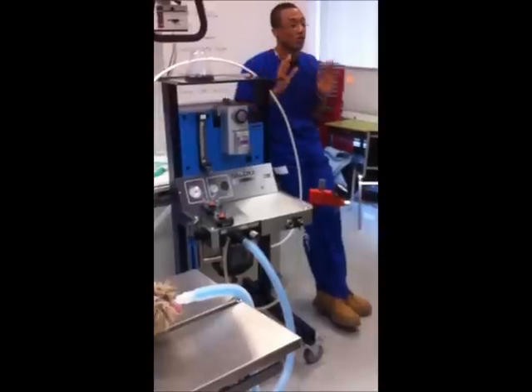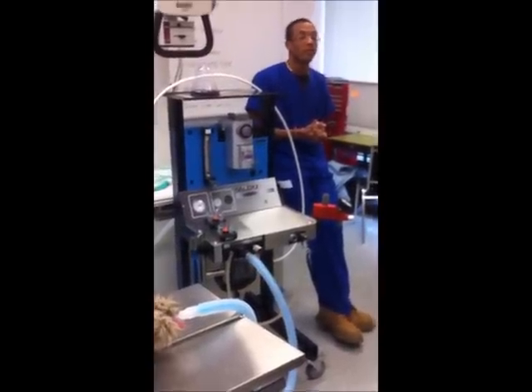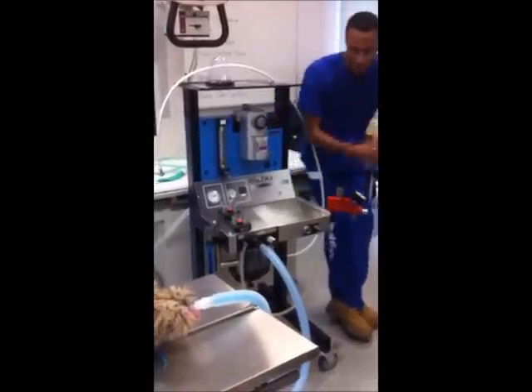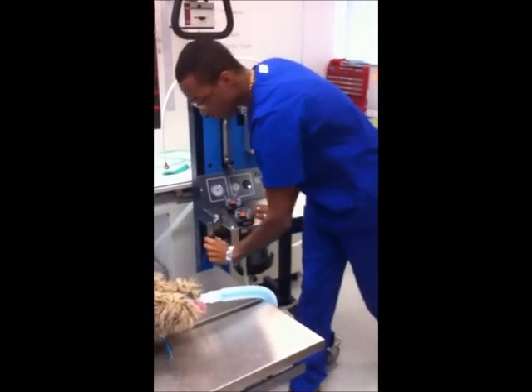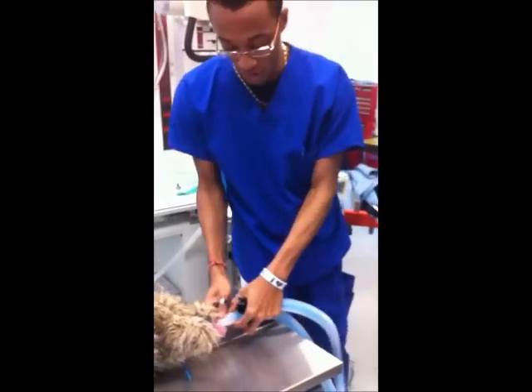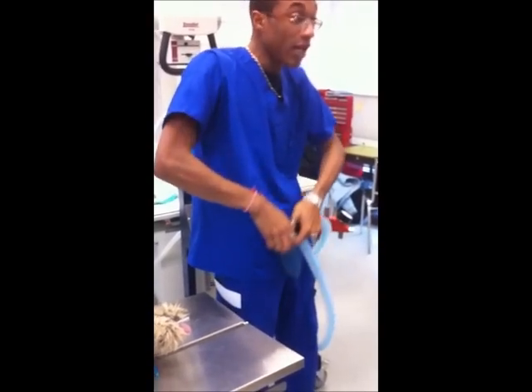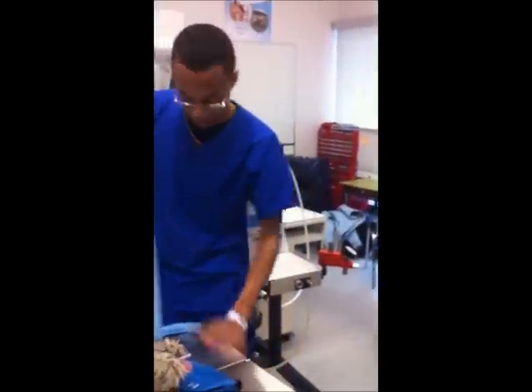Okay. Do we have any questions on the rebreathing system? I take that as a no. Okay. So, I'm going to unhook this, and I'm going to ask one nice little volunteer to help me out in setting up the non-rebreathing system.